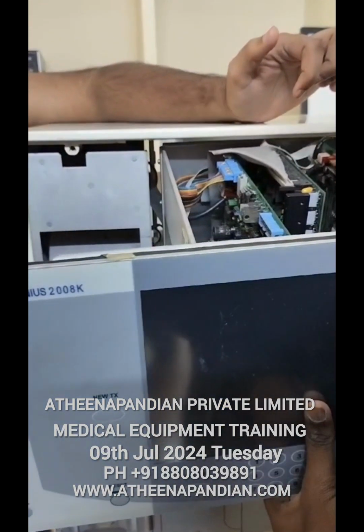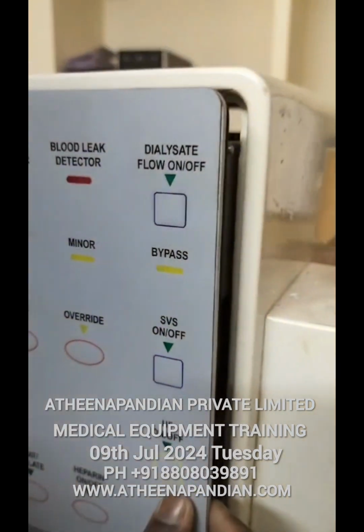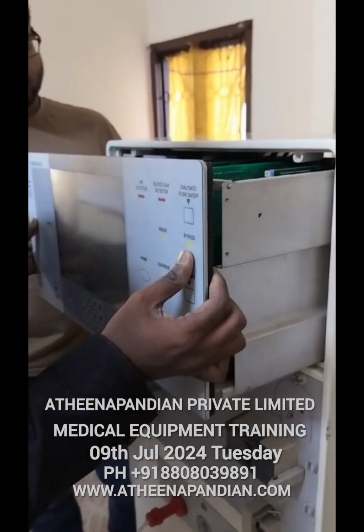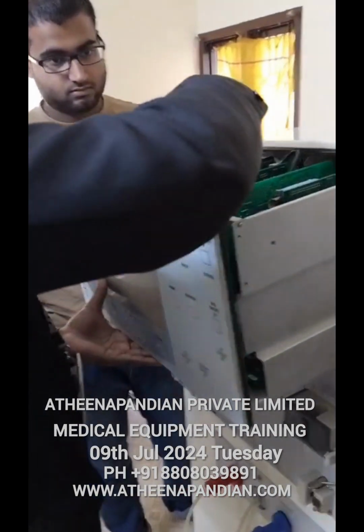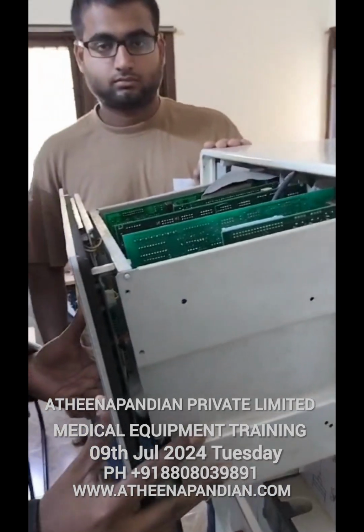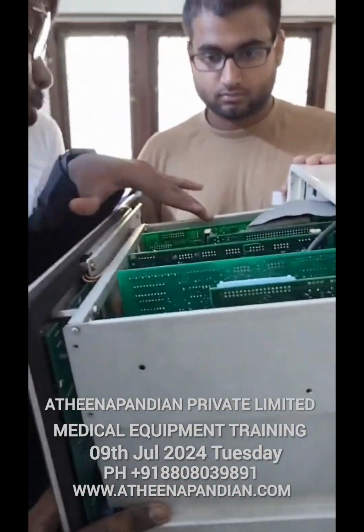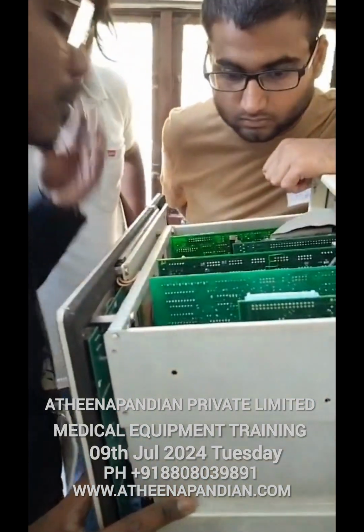No, the sensing element is another thing I can show you. This area is only for transmission, for sensing the things, for the data. So I will show you what boards are inside. You can see if the display unit and control units are failing, how to check that. First of all, this board's name is called power supply. The problems come from the power supply. In the first board you can see inside what major components are included. You can come and see the things. You can see what boards are majorly used.